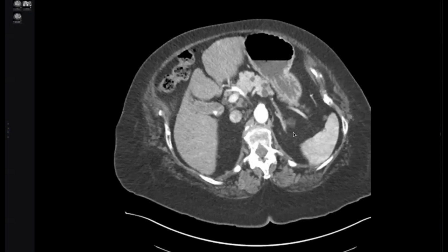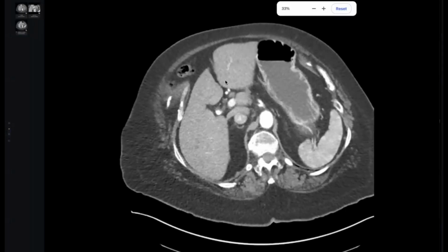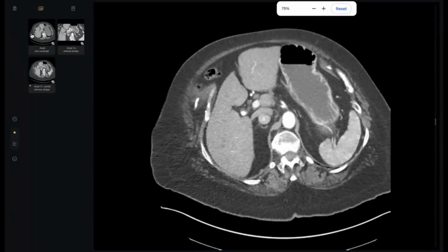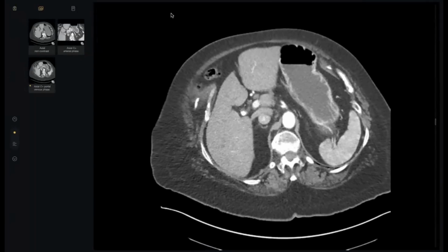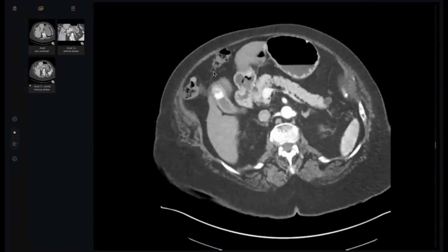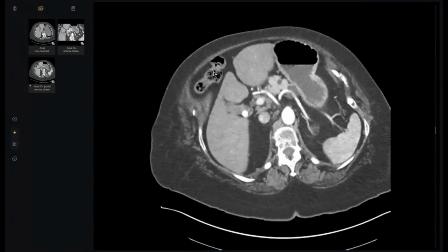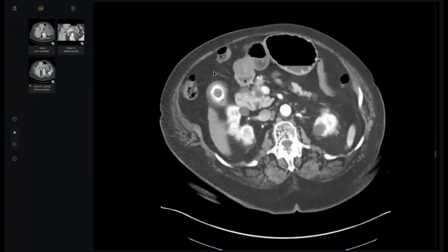Thank you, Doctor. Really amazing. Why? Because as I told you many times before, the pancreas is a big problem, especially in old age. This patient is almost 70 years old, and the pancreas is almost atrophic. And here, what happened? Some cysts, most of us will consider, okay, this is a simple cyst.